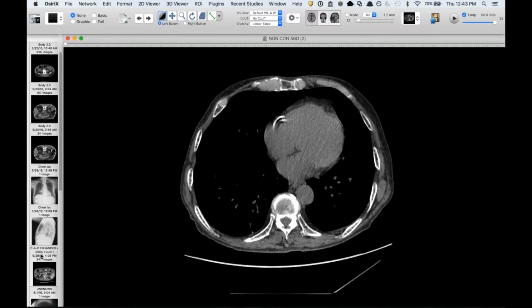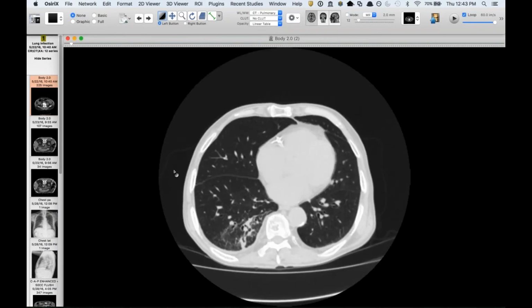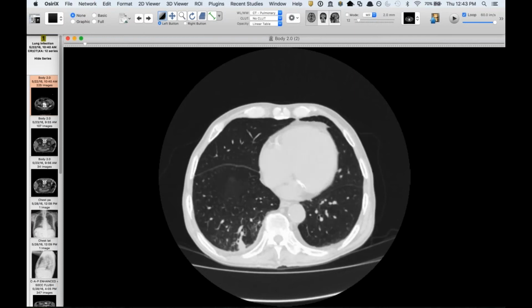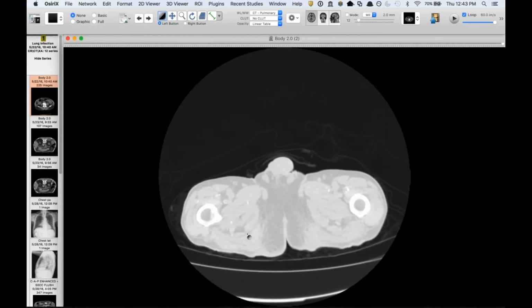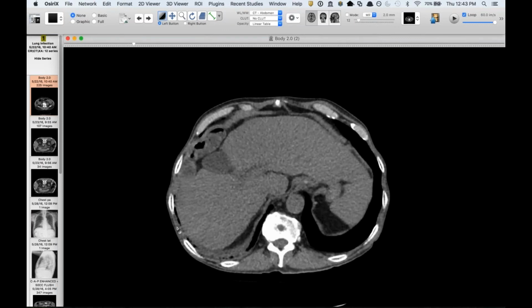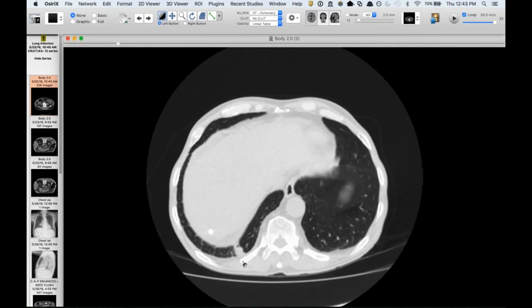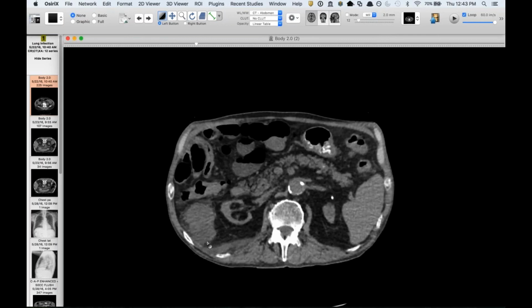And then you've got this interesting one here. This guy was a renal transplant a while ago, and this is a long and complicated history, but he came in with pneumonia in his right lower lobe, and they eventually did a biopsy to show the organism, and he refused treatment at the outside hospital, and I'll show you more of it later. But then a couple months later, back in May, he developed right-sided flank pain, and you can see that he's got a little bit of pleural thickening and has this little tail from his lung, I think, into the pleura, and then into this big retroperitoneal collection, if you will.